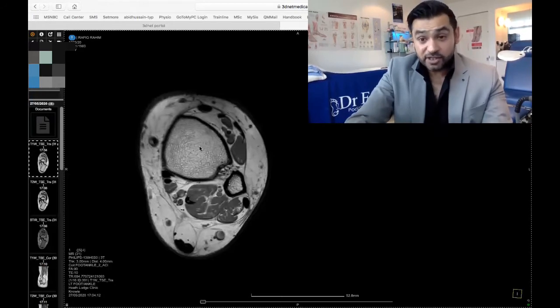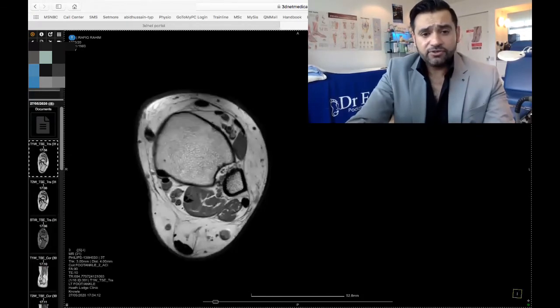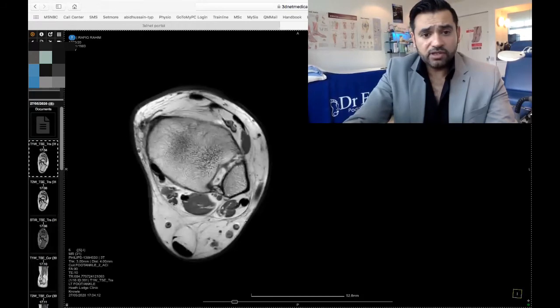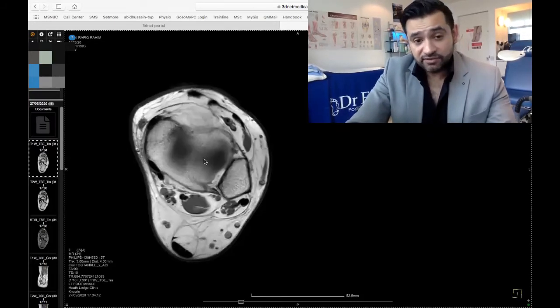So, first of all, hope you can see that. That is the tibia, and that is the fibula. That's the two bones. I'm going to go back over all the structures in a minute, but let's just go over the bones a little bit. And then we'll go back to it. When we go further down, we come to the tibial plafond here, which literally just means ceiling in French. I wish they had some Arabic words for this as well, but this is a discussion for a different time. Then that is the tibial talar articular surface.